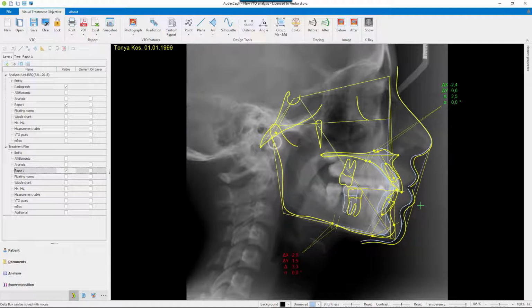And as a surgeon, I know exactly what the rigidity of the tissue is, so I need to do the changes. If I need to do the changes, I do the changes just by clicking the tissue and changing something. For example, the position of stomion and so on. So I have tools to change that. So the computer will calculate the tissue movement, and the fine-tuning can be made manually.